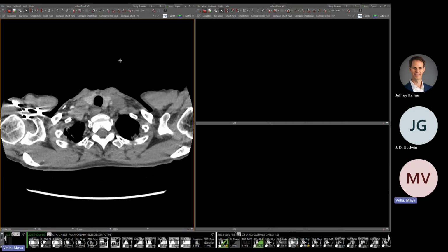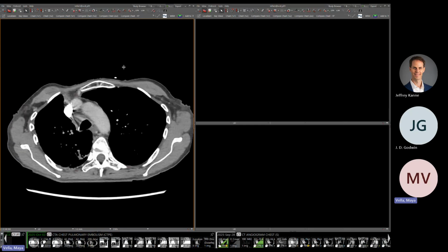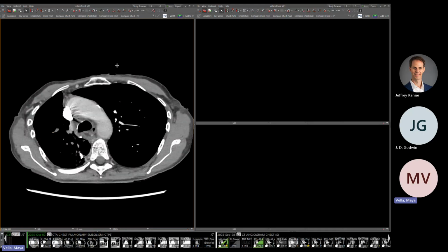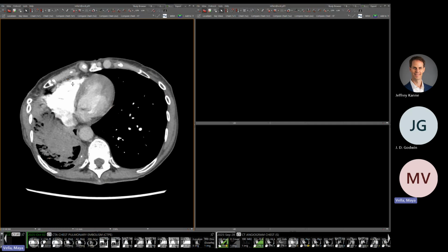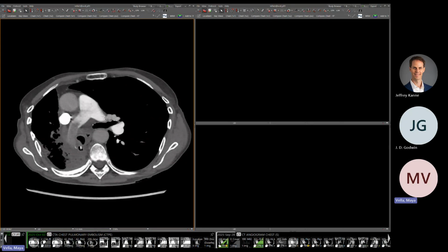All right, this I think is just a nice example of a classic thing that trips people up that I've seen happen not that infrequently, unfortunately. This was a patient who has a history of cancer, is undergoing treatment, and came into an outside institution with shortness of breath and hemoptysis. And so, as is common in the emergency room, they got a PE-CT, right? We can see quite a bit of contrast on the right side of the heart and in the main pulmonary artery. And obviously the contrast is not equal on both sides. There is definitely lower density here.